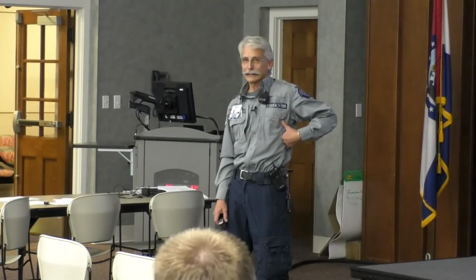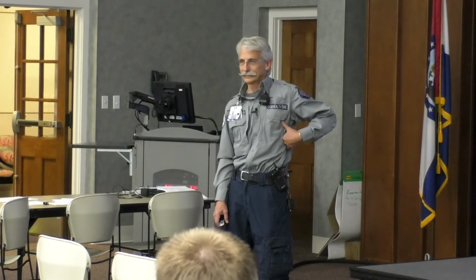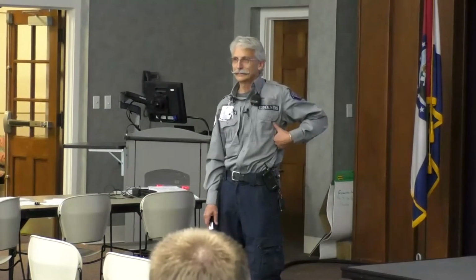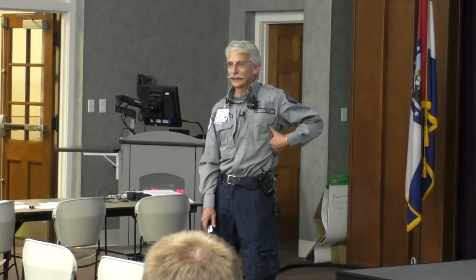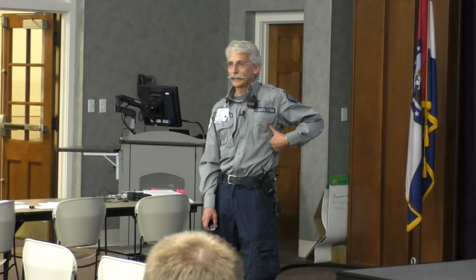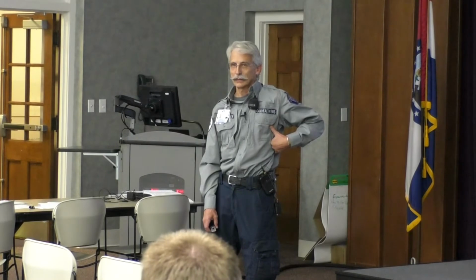What do we call that? The widowmaker. We do call it global. This person's major artery is occluded very high. We got to get this fixed soon.